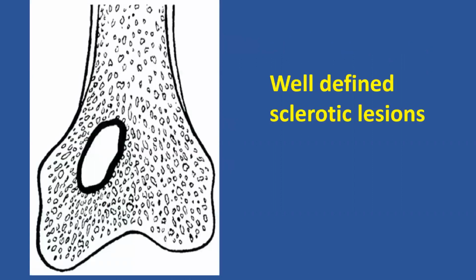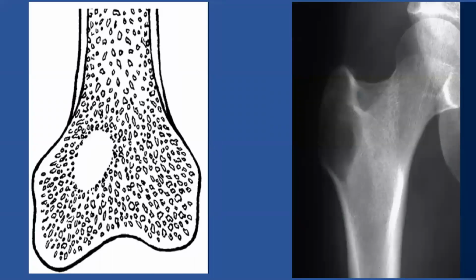Let's look at certain lesions. If you see a lesion occurring in this region, which is in the metaphyseal epiphyseal region or epiphyseal metaphysis, you see that there is sclerosis. It's a well-defined lesion. It looks benign. So on plain X-ray, we can say it's a benign lesion. This is a less defined lesion. We see that the boundaries are clear. We see normal tissue in one region and we see abnormal. So we clearly can identify the boundaries of the lesion. So this is more aggressive than a sclerotic lesion, but not very aggressive.